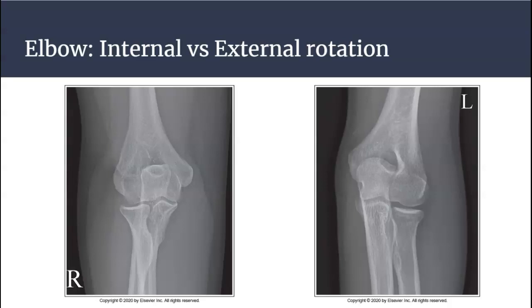If the humeral epicondyles are not positioned in profile in our second example for the AP elbow projection, and less than 1/8 of the radial head is superimposed over the ulna, the elbow has been externally rotated. That is bringing that radial head, neck, and tuberosity away, and that's what happens when we do the external oblique. We're trying to free that up of superimposition. However, we do want to see 1/8 of the radial head superimposed over the ulna in the AP projection.